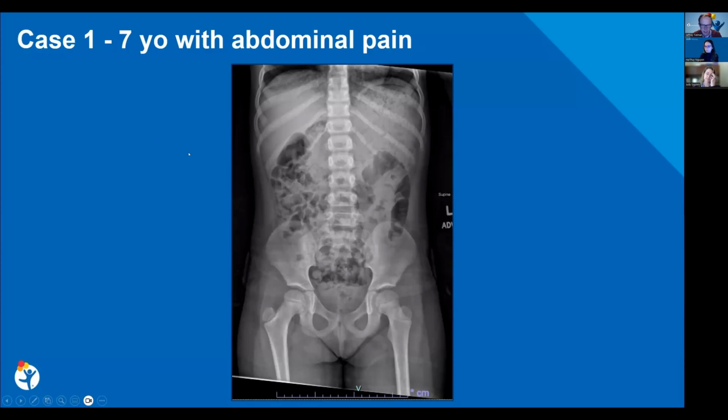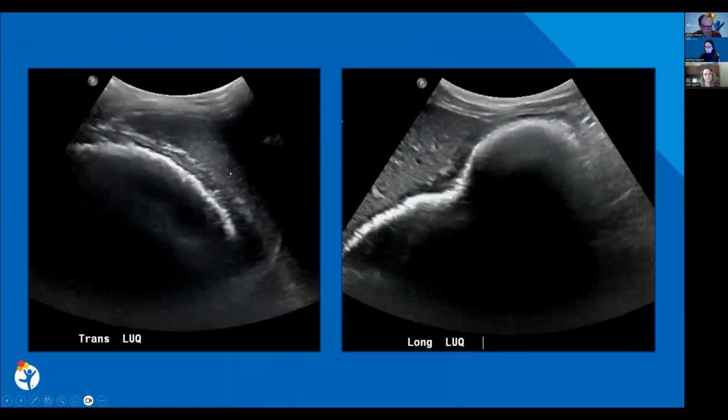They just got an abdominal radiograph. Looking at the stomach, this was initially read as just gastric contents, but the clinician called us. They said this patient had been NPO for about 8 or 9 hours at the time of this radiograph. Are you sure that it's really gastric contents? At that point, we said it could be something like delayed gastric emptying, could be a bezoar. We're not really sure what that is, but we wouldn't expect to see that much stuff in the stomach that far NPO. So we suggested an ultrasound to get a better look at that.